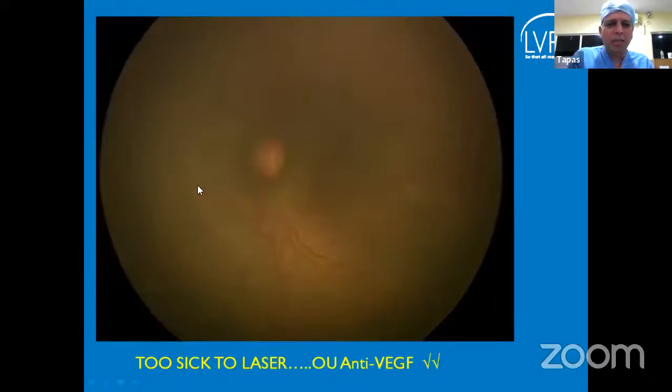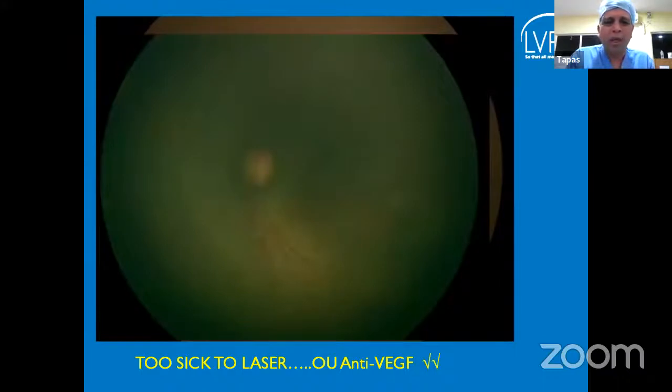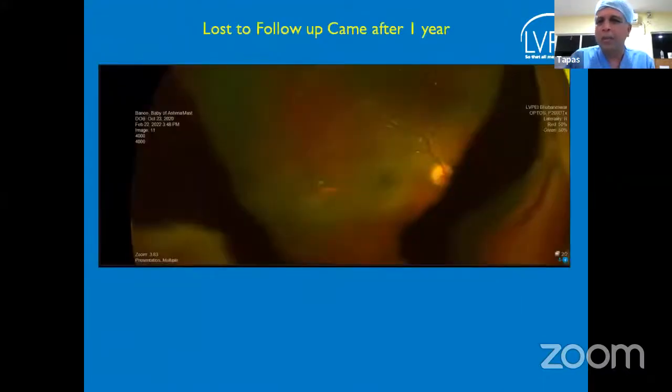And again, the blood vessels show numerous arteriovenous shunts at multiple levels, and there is a corkscrew shunt running almost all around. If we want to analyze this better, we don't have a red-free filter in those cameras, but we can do some red-free enhancement and get a better idea. The baby was too sick for laser, so intravitreal anti-VEGF was given. After that, the parents were lost to follow-up for 1 year, and then they came back.